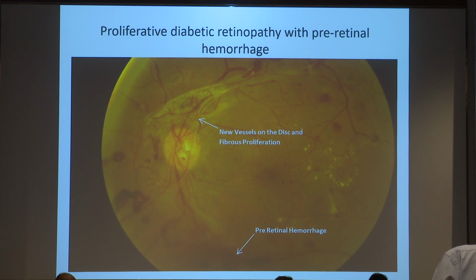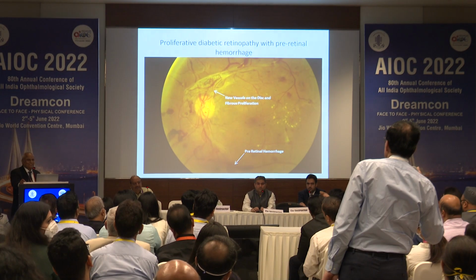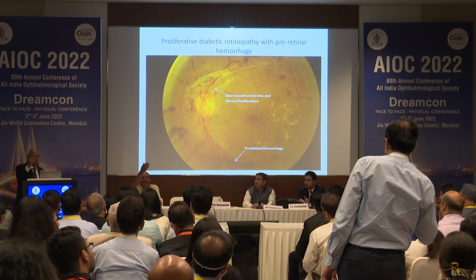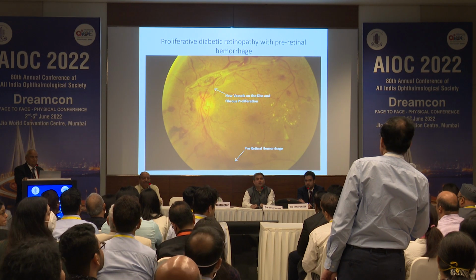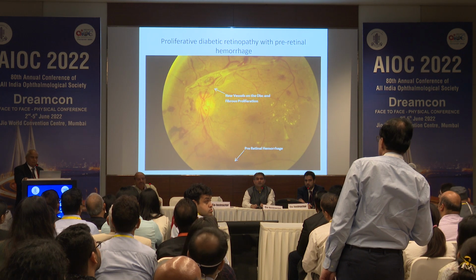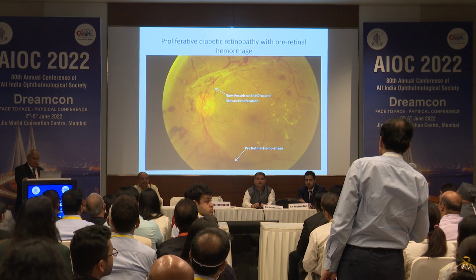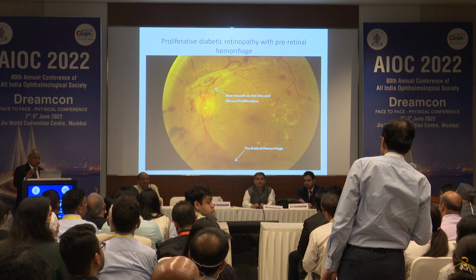Okay. But maybe there is some vitreoretinal adhesion also. This patient has got it. It will lead to the retinal detachment. Actually, there is traction, so OCT is okay. This patient has got both the things, maculopathy and the neovascularization. So you have to treat the maculopathy first. So do the OCT.